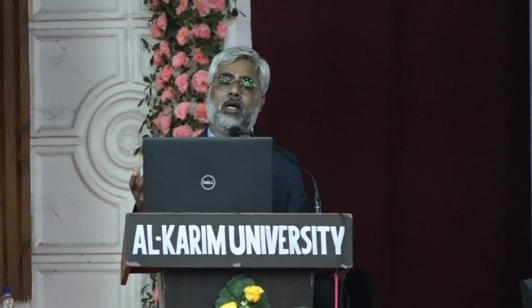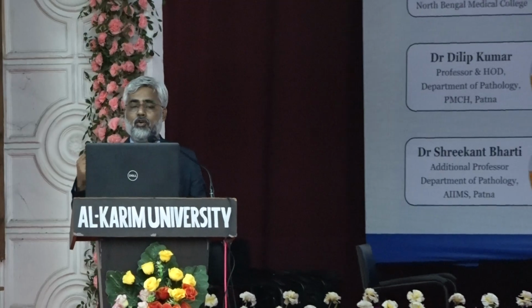I will go to the other pattern, plexiform. When we see plexiform, what is it? Like a thick, tortuous, bundled thing. So you may get this pattern in the neural tumors, then you have to make a diagnosis of plexiform neurofibroma.